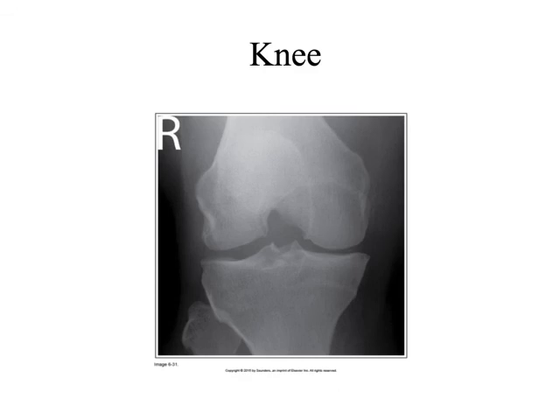Okay. Here's an image of the intercondylar fossa. So this would be a posterior anterior axial, so a PA projection, like the Holmblad method, right? Where we have the patient's knee only slightly bent, and we have an angle on the central ray to open up that intercondylar fossa. Okay?